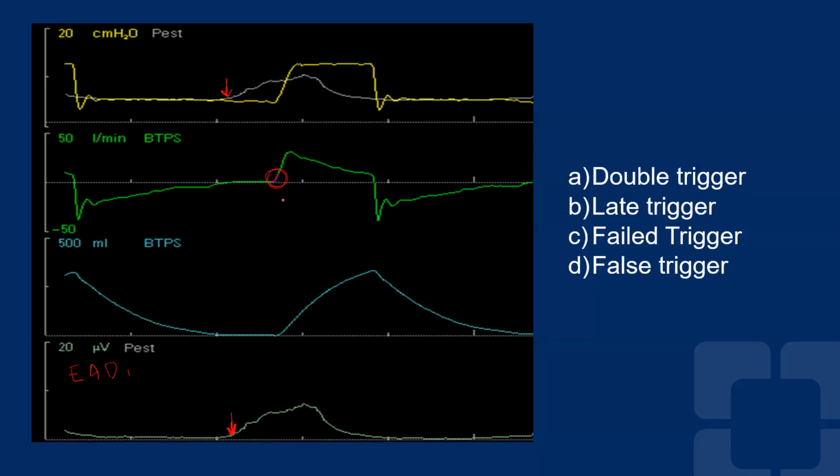At this point, what we know is that ventilators should trigger within 100 milliseconds of receiving the signal. And so if you see something longer than that, that may be an issue. But the key here is to recognize it and then try to minimize it by adjusting your trigger threshold, ensuring that that's good, or if the patient has high resistance, improving that and whatnot. Now, somebody asked about an esophageal catheter. You can also use an esophageal catheter if you have it available to read that.